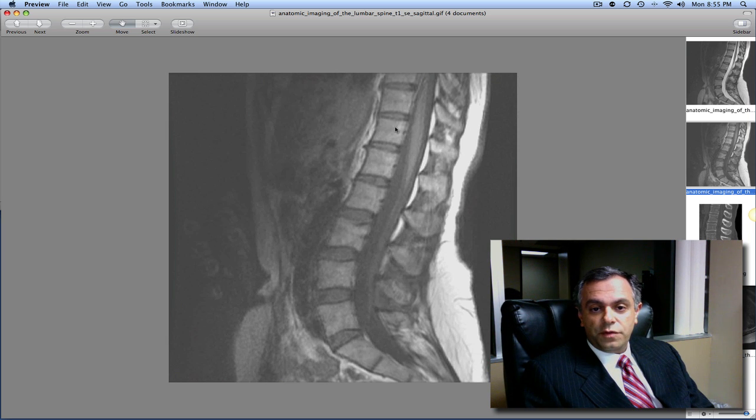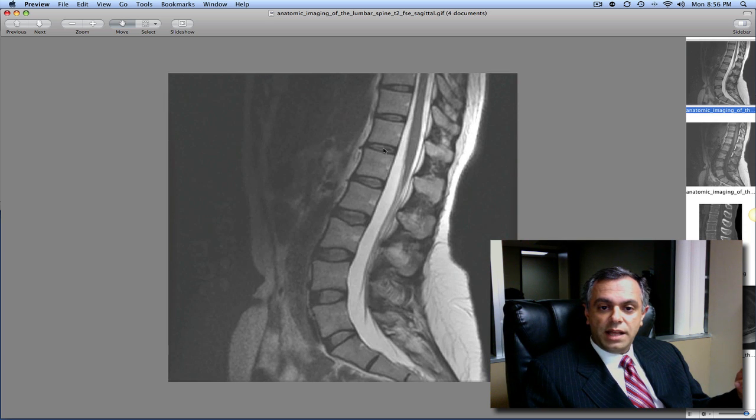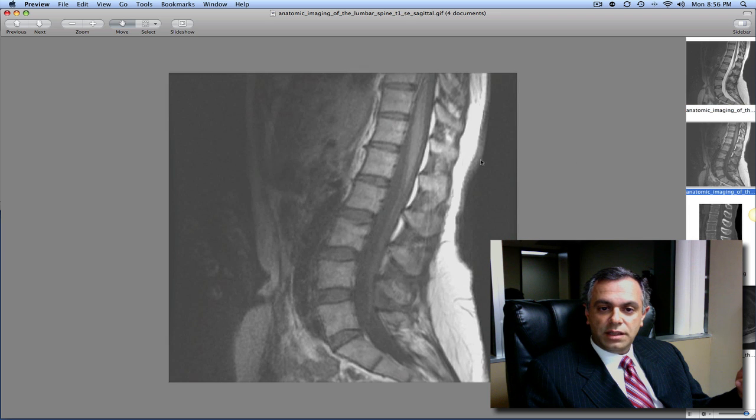But basically, for you to understand is that they sort of show you the same view. So if you look at this one, and you look at the bone and the disc, and then you look at this one, and you look at the bone and the disc, you know what they're talking about. And you wait for the doctor who you visit to explain to you more.